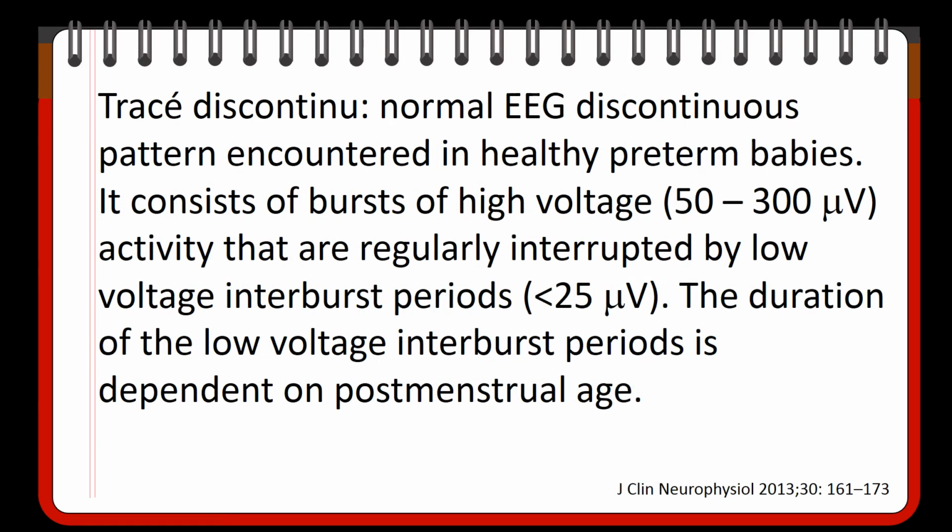A second definition of tracé discontinu is as follows. Tracé discontinu is a normal EEG discontinuous pattern encountered in healthy premature neonates. It consists of bursts of high voltage activity from 50 to 300 microvolts that is interrupted at regular intervals by low voltage activity.